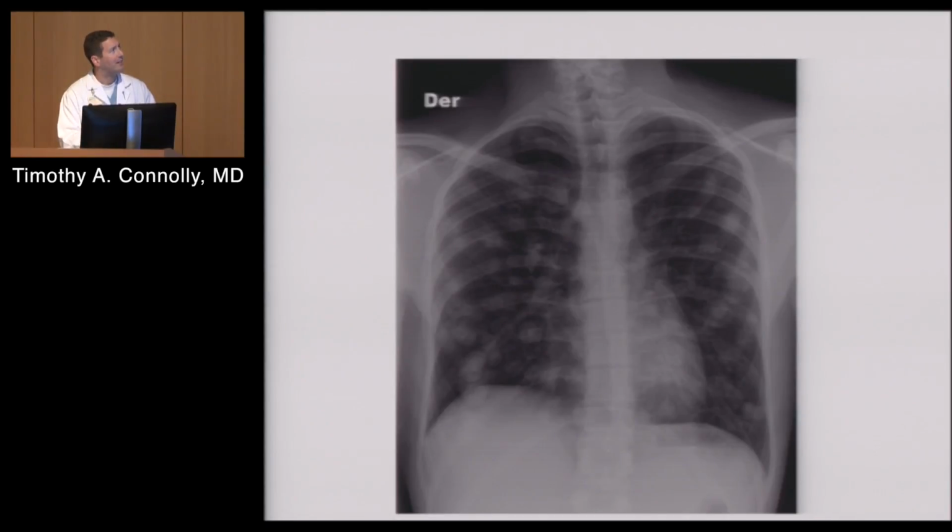This is not a good sign. All these little smudges that you see everywhere, bang, bang, bang, bang, bang. This is just something that has spread from elsewhere that is obviously hematogenously spread. You think about the blood flow into the lung, and it just carried cancer everywhere. This is not going to be a good outcome.